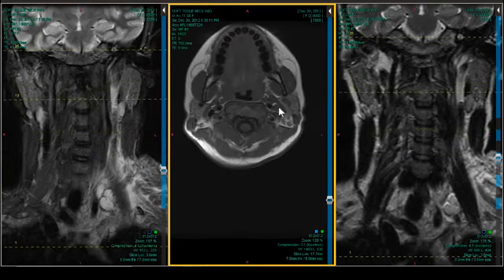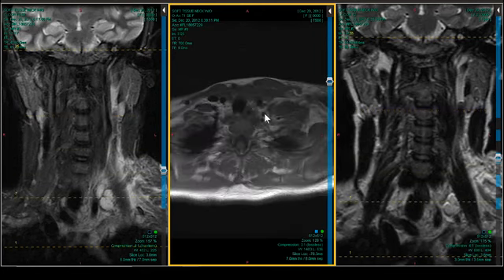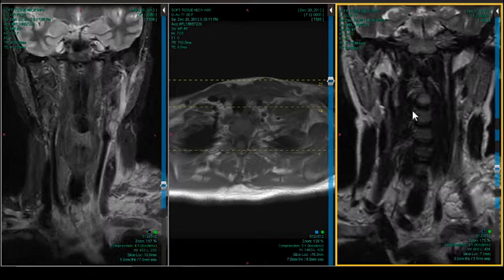That is all acute clot. That is all acute clot. There compared to there, it is gray. And look how distended it is down low. The whole thing is filled in. And what else are you seeing? You're seeing subclavian thrombosis and diffuse swelling from venous engorgement and congestion.